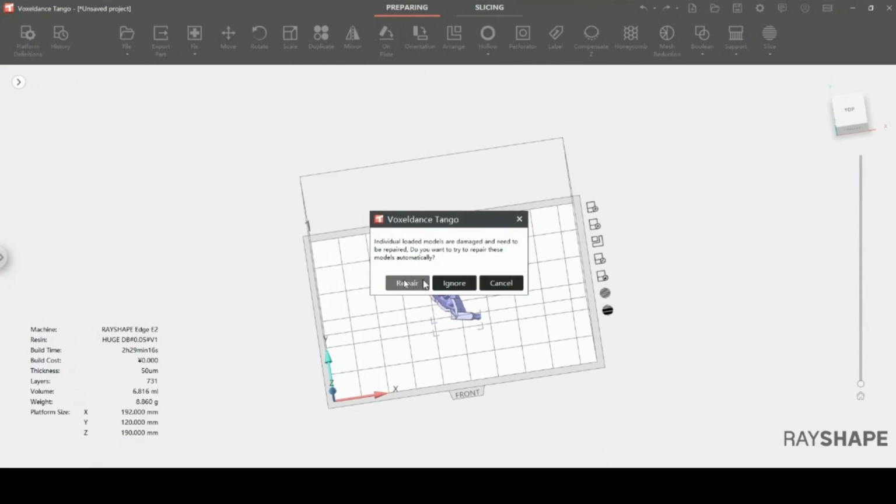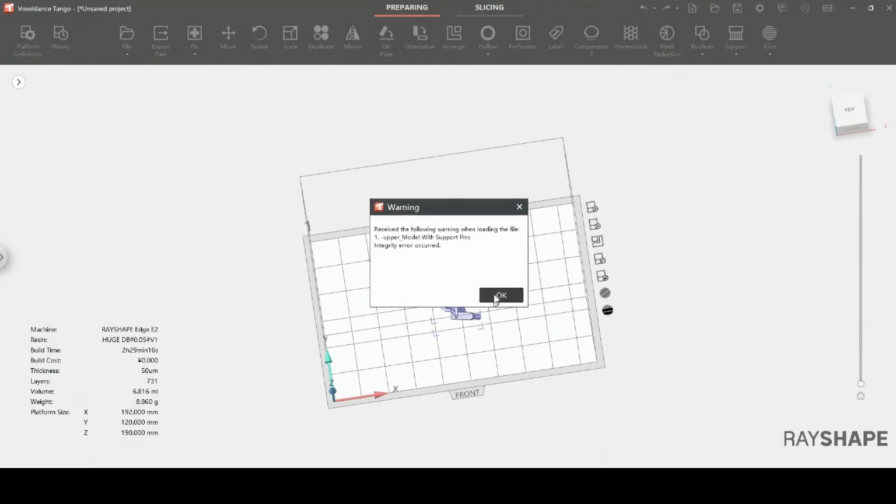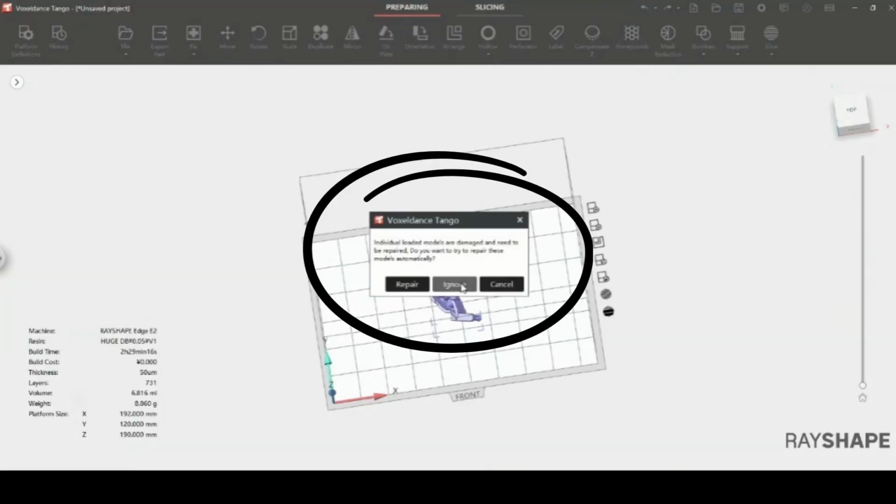We are opening the file. It will open. Now, you will get a warning. Usually different types of files are recorded in different ways. When they're saved, sometimes they save in different X, Y, and Z angles, so the different position might throw an error. Not on this one. The good thing with the nesting software is that it allows you to repair broken mesh inside the STL file.